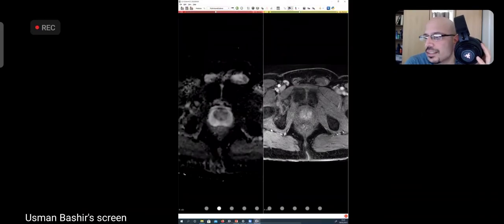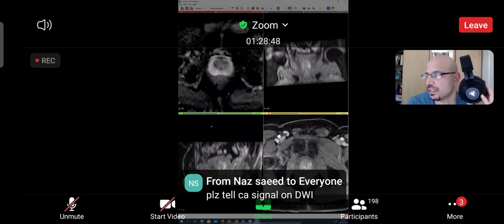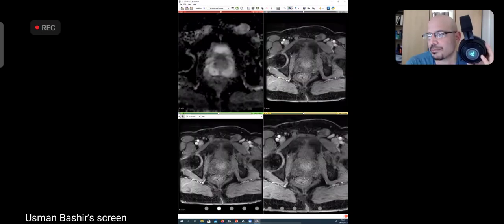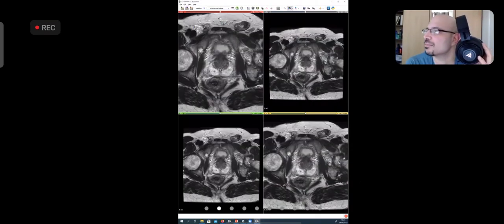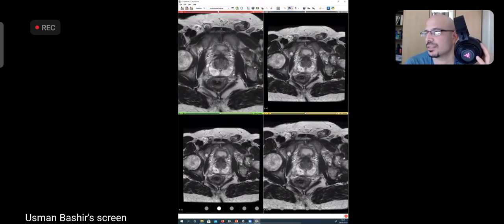You may be a bit disappointed that it's not so impressive either, but that's the name of the game. You have to label this uncertainty as PIRADS 3. PIRADS is also a way to label your uncertainty. Okay, look, I don't know, therefore it is PIRADS 3. Please don't go and report everything you don't know as PIRADS 3. You've got to identify where you need to ask for help as well. It should not be used as a crutch. If you think you're not adequately experienced, then ask for help from somebody with more experience.